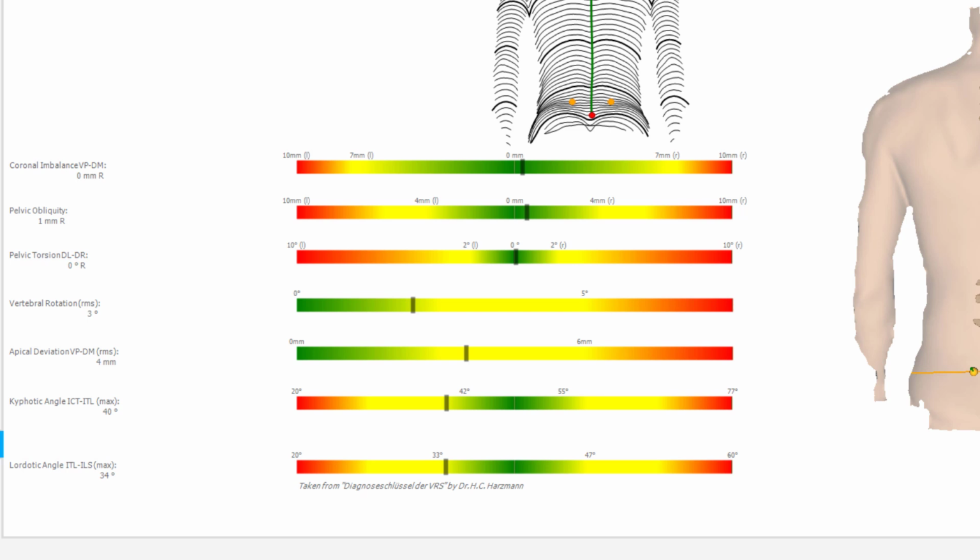The many clinical experience values of the past 25 years have clearly shown that isolated deviations do not always have to be pathological. With a multitude of bones and joints in the human body, the norm is defined by deviation rather than perfect symmetry. In addition, there are interactions between different postural parameters. For example, an increased surface rotation usually comes with a noticeable lateral deviation. Overall, this page is certainly quickly understandable, but communicate carefully to your patient.